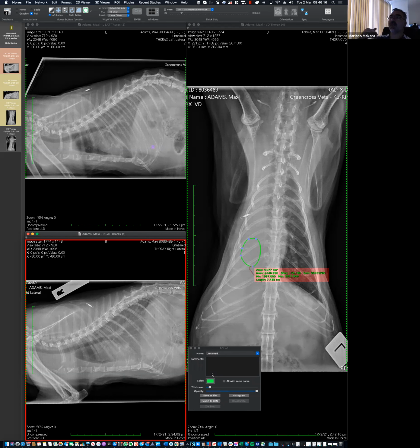So if you have a normal animal, let's start with a normal animal. You have an animal with the two lungs working okay. In that scenario, when you put it on its side, there's an immediate partial atelectasis of the dependent side. It's not severe, it's partial, but enough to make the visibility of those vessels reduced compared to the ones that are up.